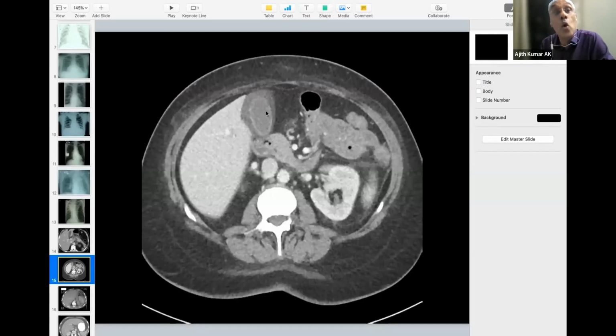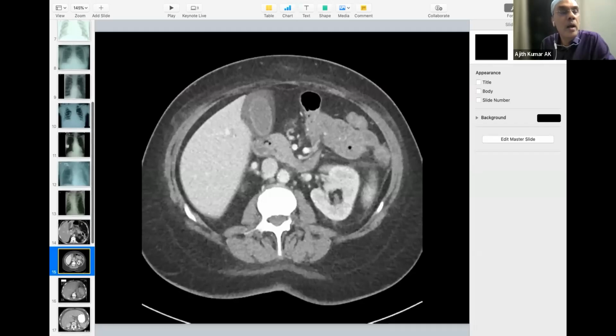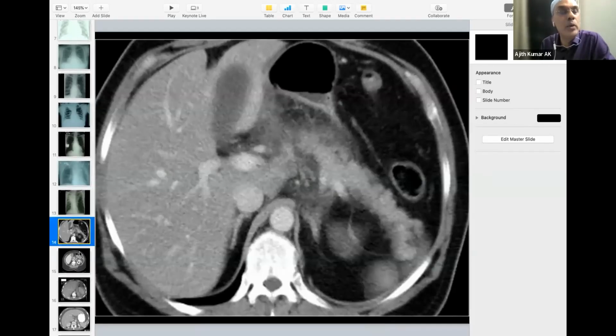You see the gallbladder, which is distended, but there is no stone there. A pericholecystic collection is there. The patient is very sick. Means sometimes the patient is too sick, then you can go for a bedside percutaneous cholecystostomy. Then later on you can go for a cholecystectomy. But I just want to prime you on this; I didn't fully understand it and I don't want to discuss it.